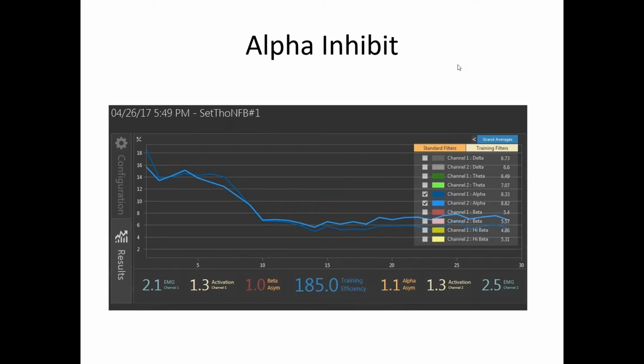BrainMaster, for instance, has a really interesting review screen where you can see how much all of the locations move into the plus or one standard deviation or 1.5 or 2 standard deviation range. So you would be looking for all of the lines to move towards the center of the screen. In our option, you're looking for lines to move towards the bottom.